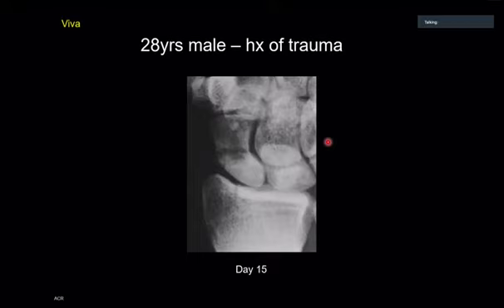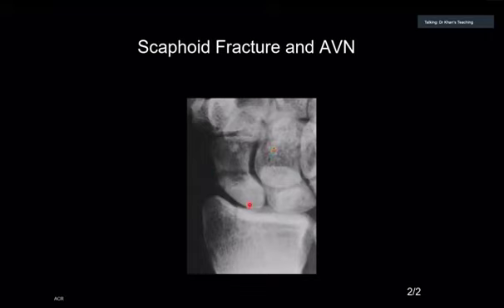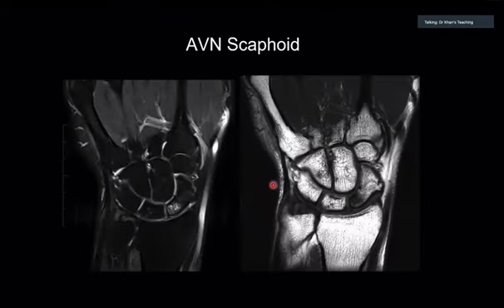Right. So avascular necrosis, where the bone on a plain film, what happens is that this of the scaphoid classically is where the blood, or the vessel, is coming from here. So it gets disrupted, and on a plain film it will become sclerotic, while on MR this is what is going to happen. So there is a fracture here which is not very well seen, but you can see that the proximal pole has got low signal on T1 and then high signal on this PD fat saturated.